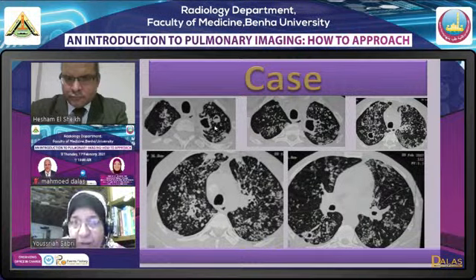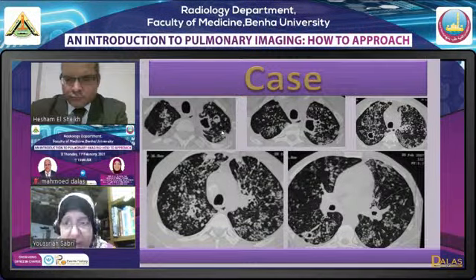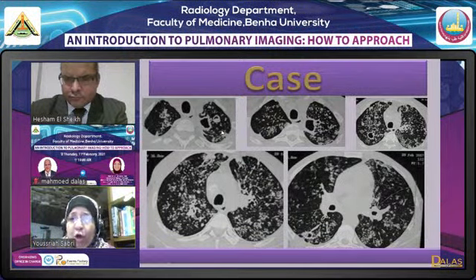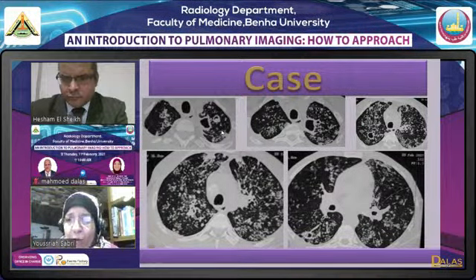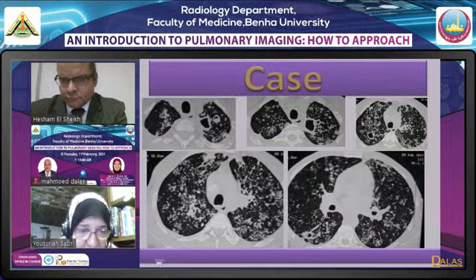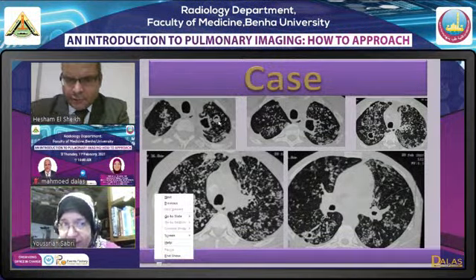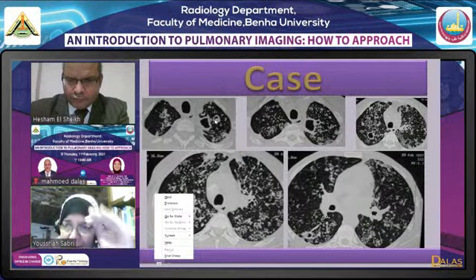تمام، هنبص برضو على منظر تاني حالا دلوقتي. يبقى انا عندي اهو سموث اوت لاين، تمام، و crescent shaped lumen وفيري يونيفورم. الوول الجزء اللي شايفينه is very uniform. ده منظر المايستوما. المايستوما باي ذا واي ممكن تكون موجوده في اي كرونيك كافيتي، يعني ممكن تكون موجوده في كافيتي بتاع التي بي، ده اكتر حاجه بنشوفها، ممكن تكون موجوده في سيستيك فايبروزس، ممكن تكون موجوده مع ساركويد، ممكن تكون موجوده مع ماركت برونكايكتاتيك تشينجز. بس الشكل كلاسيكالي زي ما حضراتكم شايفين، الوول بنت ناس، والاسود على شكل هلال.